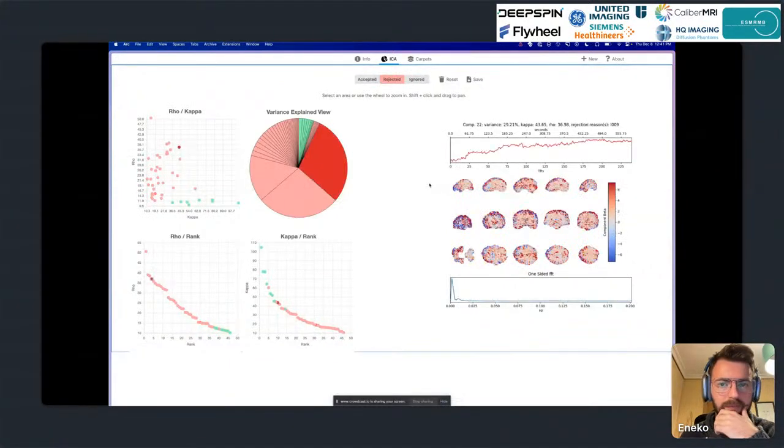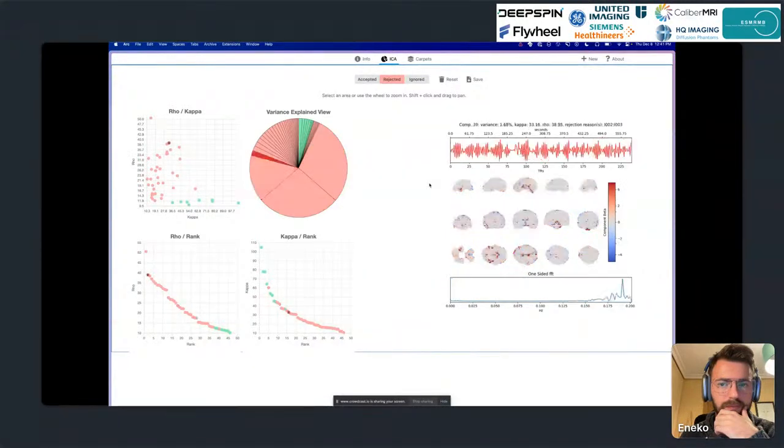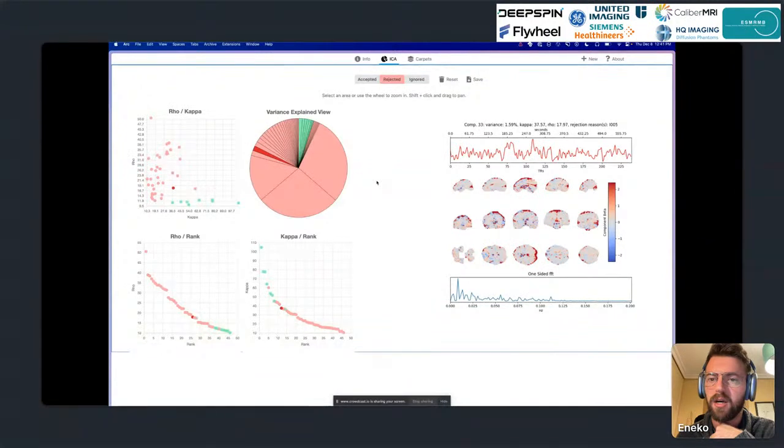I'm going to quickly go through all the rejected ones to see if there's anything that should be accepted. Oh, look at this one. So this one's a clear artifact, that when you look at this, you're like, yeah, of course, we're not going to accept this. So you're always trying to find these kinds of patterns. This one looks like it could be veins. I'm going to keep it as a reject.